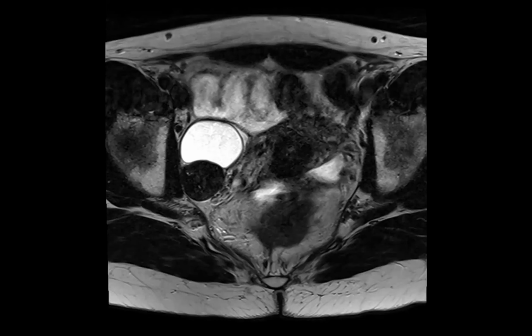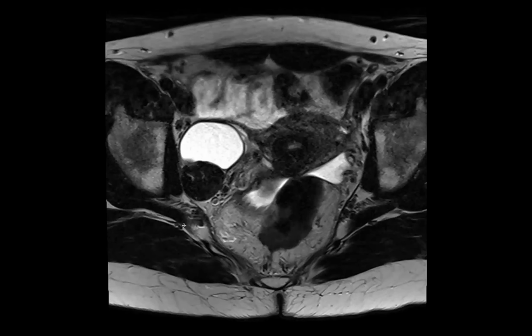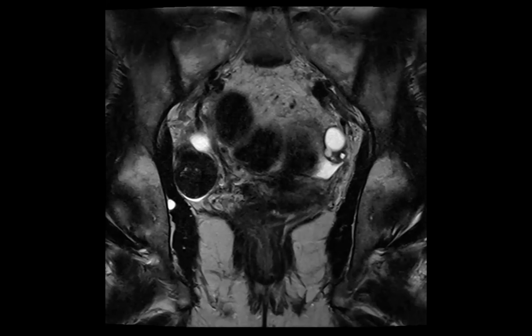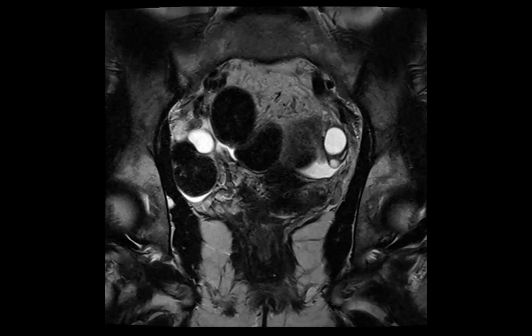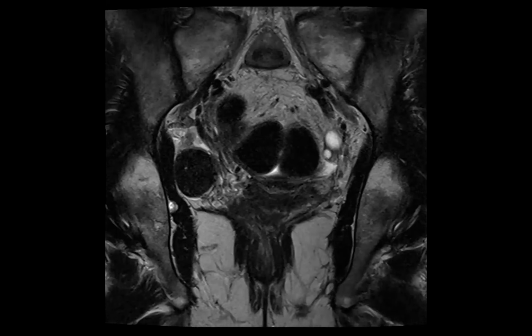I see a really T2 dark structure in the ovary. And is the cystic part of it? Is it a multi-component thing or just mainly that? Okay, it's a multi-component thing, right? I think the cystic part is ovarian, and maybe these are giant follicles, ovarian cysts. And then there's also that T2 hypointense mass, like you said.